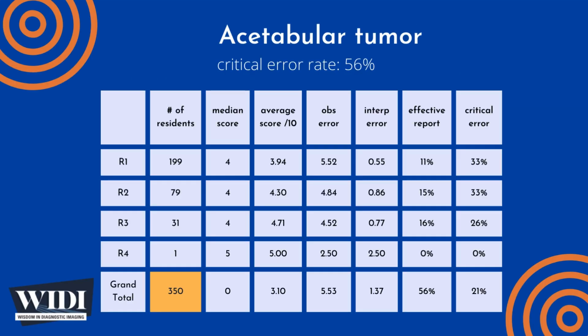Over the last 12 years, the Department of Radiology at the University of Florida College of Medicine has conducted a simulation-based evaluation of radiology resident competence in critical care imaging. 350 residents interpreted this case of acetabular tumor as one of 65 cases during an 8-hour simulated on-call shift, with a median score of 0 out of 10 and an overall average score of 3.10 out of 10.